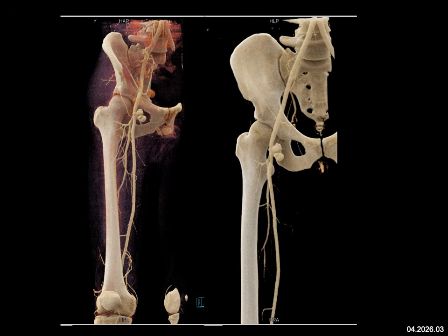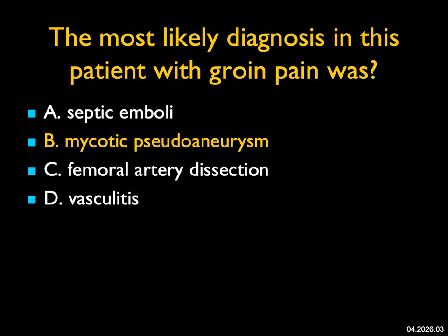This is a pseudoaneurysm, likely a mycotic pseudoaneurysm. This is a great location in a patient with IV drug abuse to develop mycotic pseudoaneurysms. A really nice example, and the role of cinematic rendering is very nicely shown.